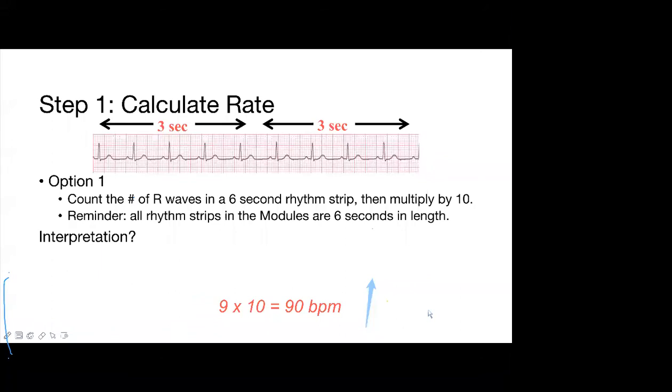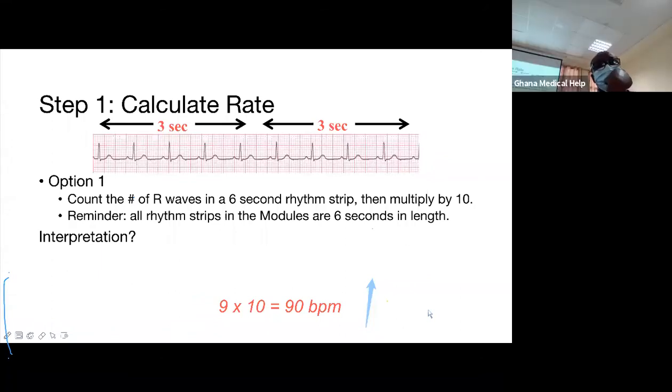In-house, any other? No, so I said there are 2 of them. They can actually add a third one if you want to be a purist: 1,500 divided by the number of very small boxes, and you can get it.